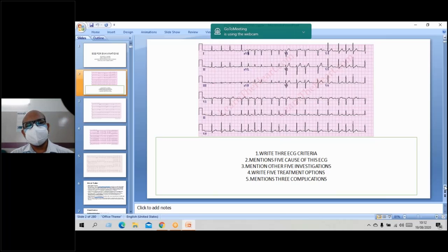So for first impression, we will search in the ECG. There are some waves, some complexes, and some other parameters. Is there any presence of P wave or not? Is the RR interval regular or not? What is the approximate heart rate? Is there ST segment, T wave, etc.? So, can any student identify this ECG?